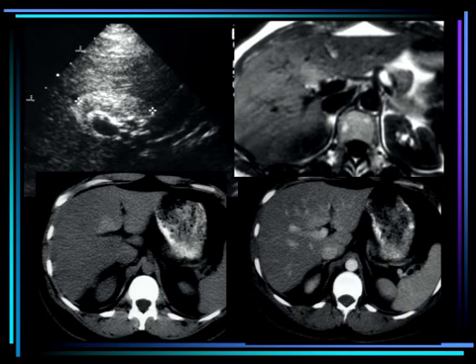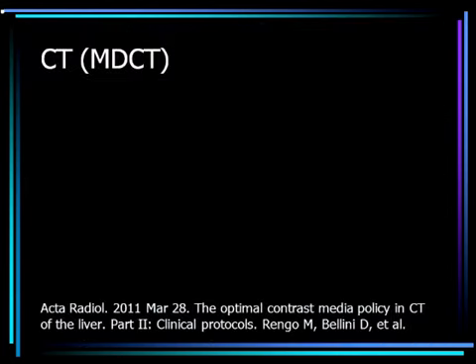And on MRI, on the upper side, on the T1 weighted image, you see that the lesion is white. So we deal with lesions in segment 4 where more or less fat is present. On CT, the whole liver is changed, and only in segment 4 it's not changed. By MRI, the whole liver is normal, and in segment 4 we have more fat. So segment 4 is a segment you have to be very careful with.